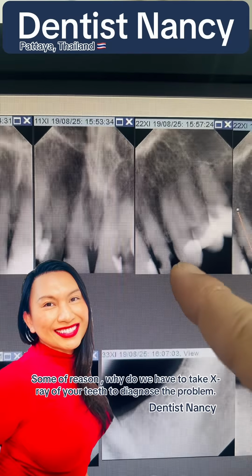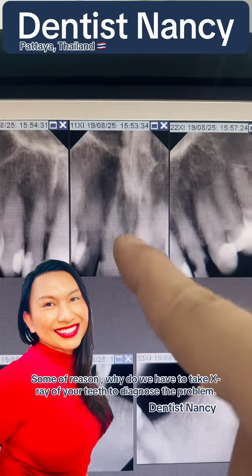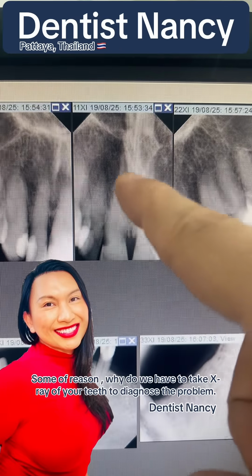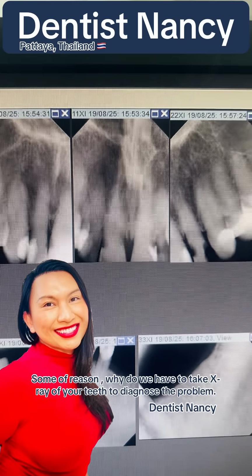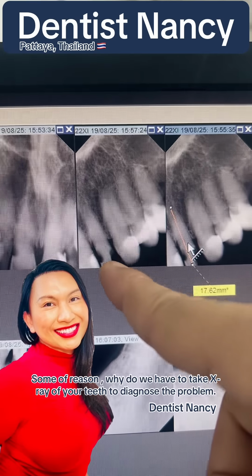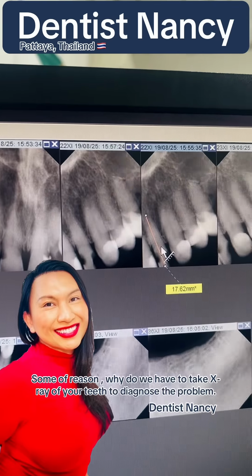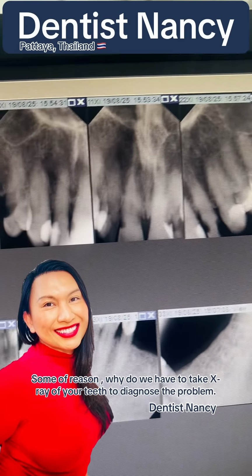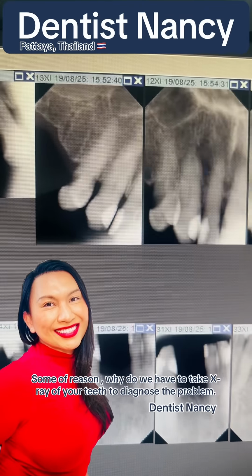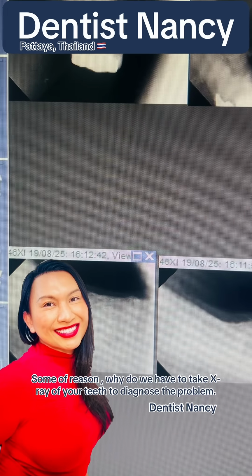And we can also check how deep the cavity is. So just like this, when you have a cavity, we want to know how deep the cavity is. And we want to see if there is any infection inside the tooth or around the tooth root. Like this tooth, for example, there is a nerve inside the tooth. We want to see if the cavity that you have is exposed to the nerve or not. This is the reason why we need to take an X-ray when you come to get a filling or even teeth cleaning. In some cases, I also take an X-ray because I want to see how everything exactly is.